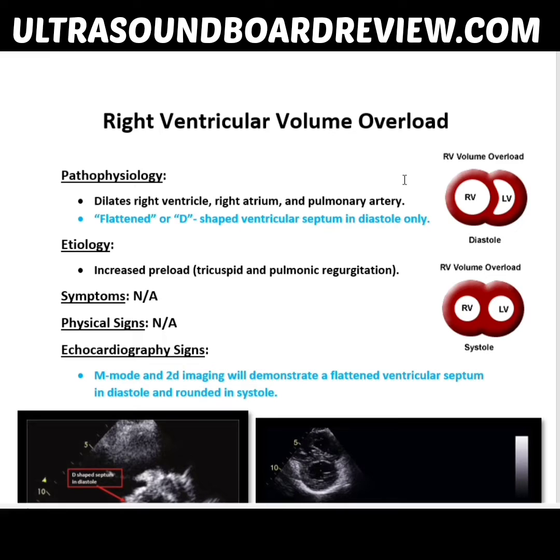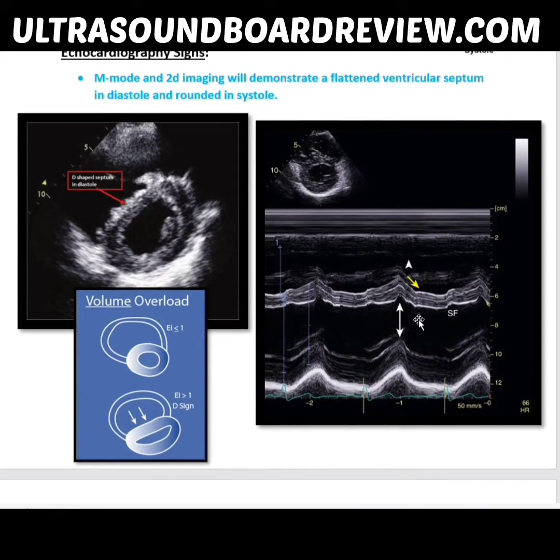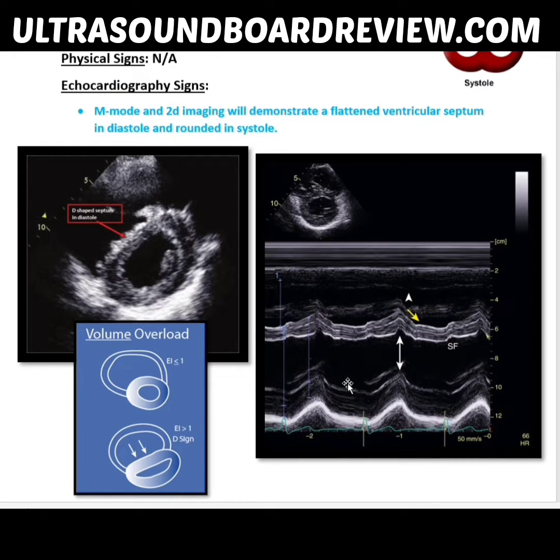So here's a good example of if you were doing M mode through the short axis view at the papillary level. You're looking at this M mode, you can see that the septum is more flat during diastole versus systole. Make sense? Yes.